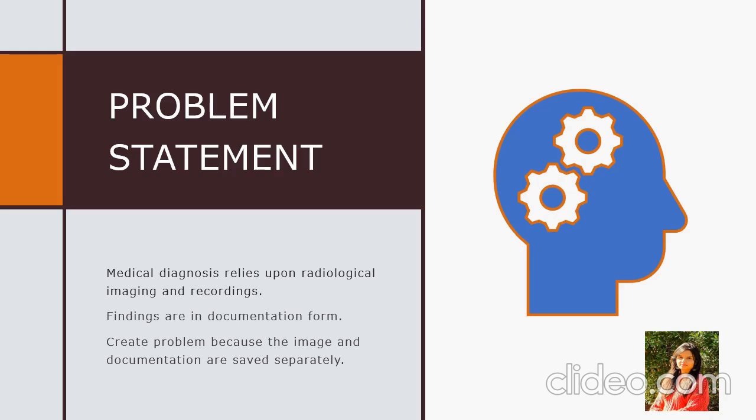Also, the user can get a better idea and judgment if the medical images are shown side by side, as one image will be in a lighter shade than the other image. So the user will be able to identify the problems while annotating those images side by side.